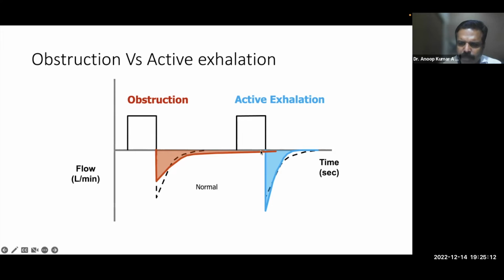or an expiratory flow limitation. One more thing you have to keep in mind: touching the baseline is what we are talking about in terms of ventilator graphics. But in actuality, what is happening? Suppose you are pushing air into an airway and there is an expiratory flow limitation, so the air will take more time to come out. If in between you give another breath, the alveoli will not be completely emptied, and there can be something called auto-PEEP or air trapping. So this is the basic mechanism.